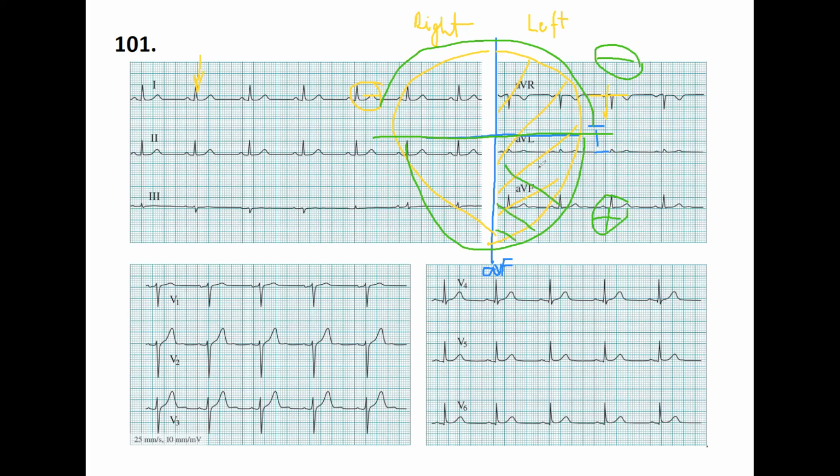What is the common part? This quadrant, that's normal. Normal means the axis is exactly between 0 and 90. That's the normal interval, and this is what you have right here.